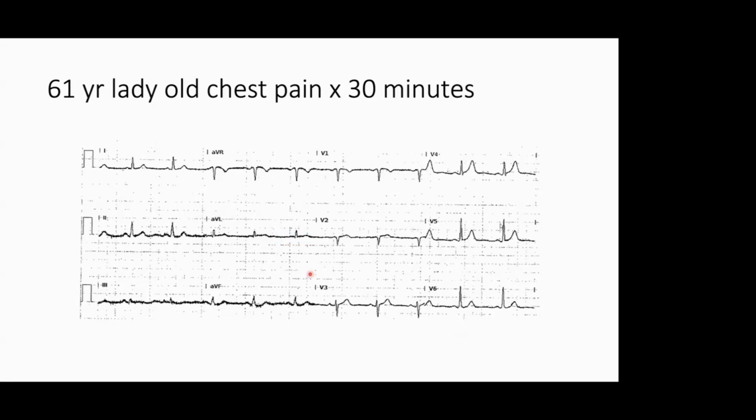So this ECG is the earliest. There is a hyperacute T, a Q wave, loss of R wave height, subtle ST elevation, and reciprocal ST depression. And finally, you have to check for one more important thing: there is a slight reciprocal ST depression in aVF. So this ECG does not fit the criteria for STEMI, but this is a hyperacute T. This is an occlusive MI. If you do an angiogram, the LAD will be occluded in this patient, but it will be less than 30 minutes. You can find all these differences in this ECG.